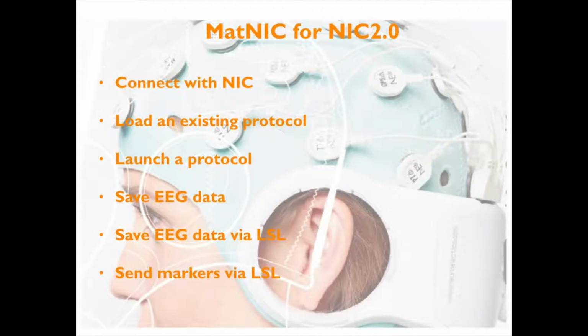Hello everyone and welcome to our quick guide to MatNIC, a Matlab toolkit that allows the user to interact with NIC 2.0. During this video tutorial, we will see how to connect MatNIC to our software, how to load and launch an existing protocol, how to read and store EEG data, and how to send markers to NIC.